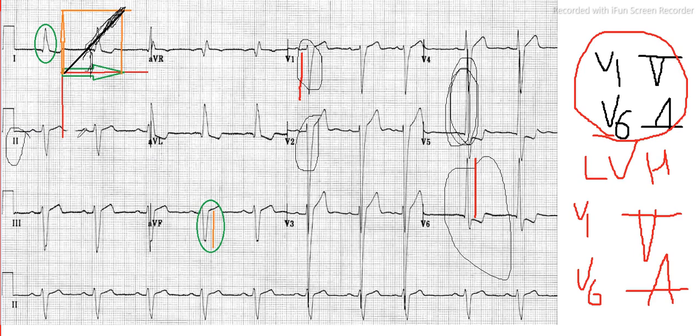In lead 2, in case of left atrial enlargement, you will find P mitral, a double-peaked P wave. However, in this case it is not clear, so left atrial enlargement has not progressed. So this is the case of left ventricular hypertrophy with left axis deviation.